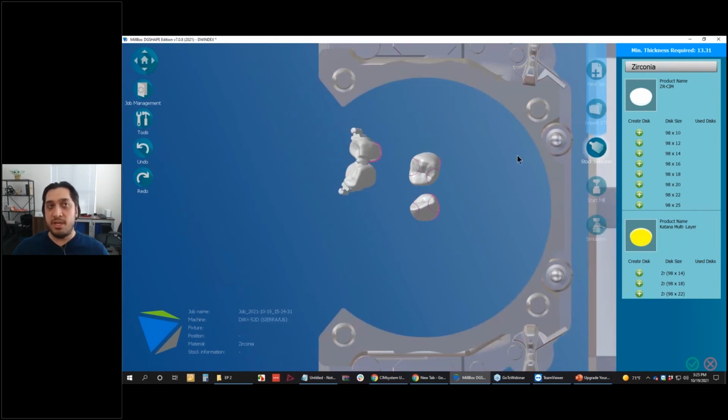In particular, if you see material start to gum up on your tools, that's an indication that you're not using the right settings to cut that material. Either that, or your tool is extremely worn out and it's causing friction, causing that material to heat up unnecessarily. Usually, if you have problems with your material settings, you're going to know right away. This is not something like, hey, I've been milling PMMA for years now, and then all of a sudden I have this issue with the PMMA and I haven't changed anything.